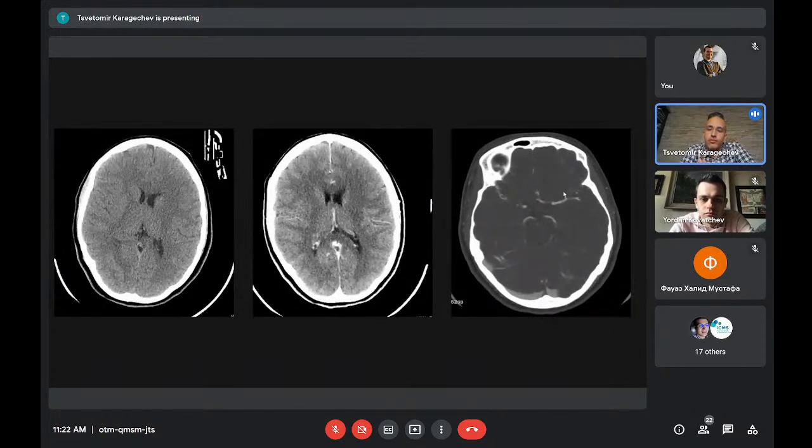It is also a contrast-enhanced imaging, but in this case, we rapidly track a bolus of intravenous contrast media in order to assess the vessels. So the difference between CT head with contrast and CT angiogram is basically the timing.